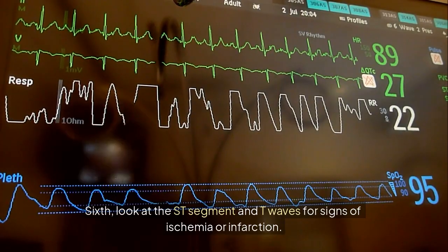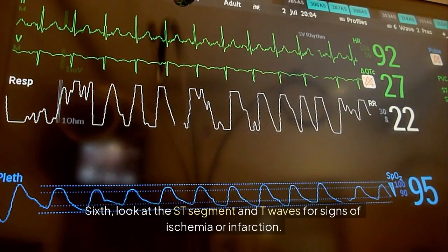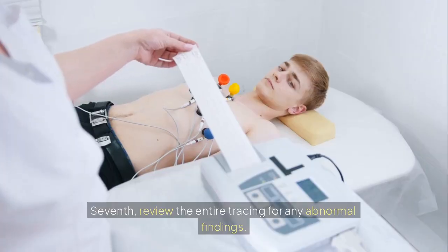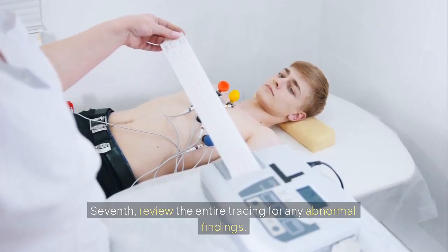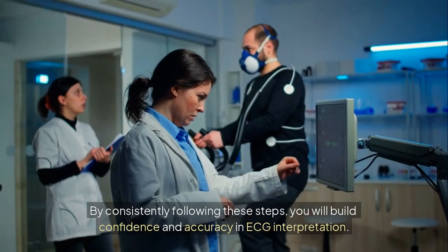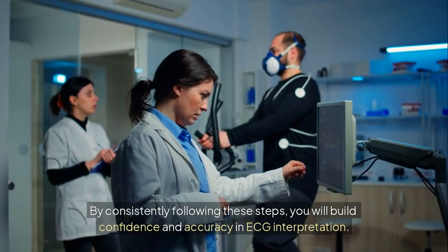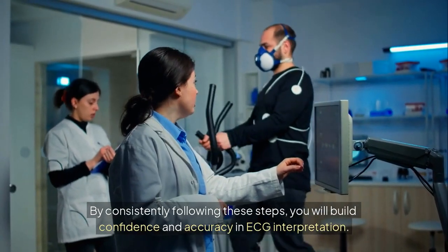Sixth, look at the ST segment and T waves for signs of ischemia or infarction. Seventh, review the entire tracing for any abnormal findings. By consistently following these steps, you will build confidence and accuracy in ECG interpretation.